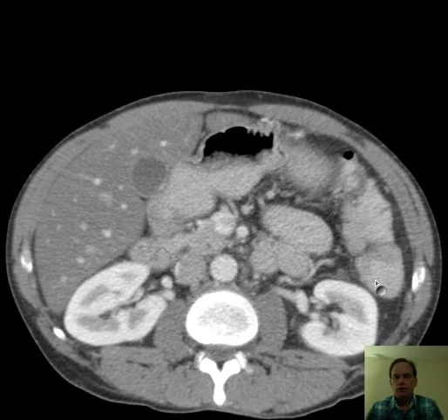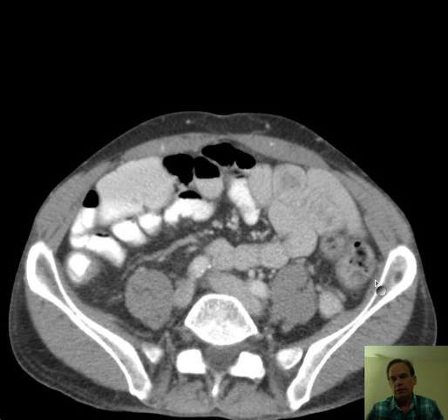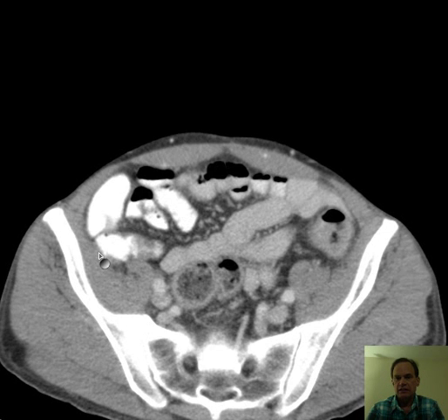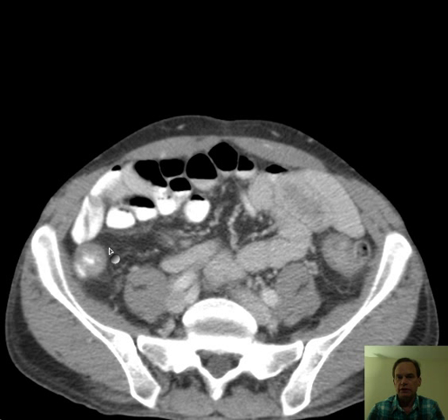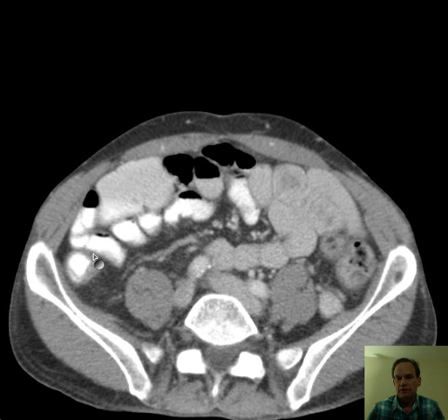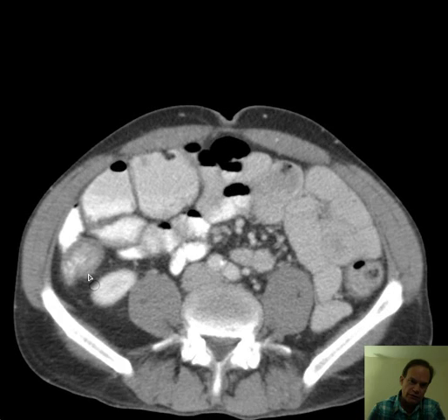So this patient had Crohn's disease in the past, and I thought, well, look, here we have the terminal ileum, and it's got these thickened segments, like right here. See, this is a nice thin border. This is a thickened wall involving a segment of terminal ileum. Here it looks circumferentially thickened, but you don't really see any stranding around that. Here we have the distal part of that area that's thickened, and still a little bit more of it there.